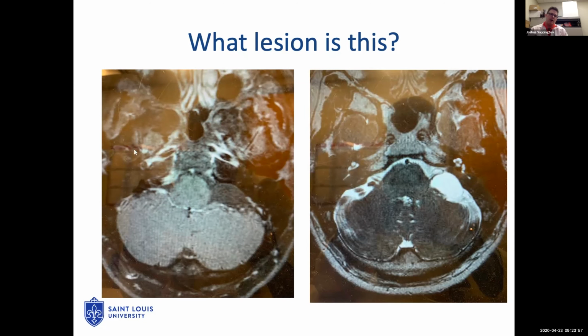So this was a patient who came in with left side tinnitus, his PCP got an MRI, and this is what it showed. So just to orient people, T1 with contrast, T2, what are you going to tell the patient this lesion is?